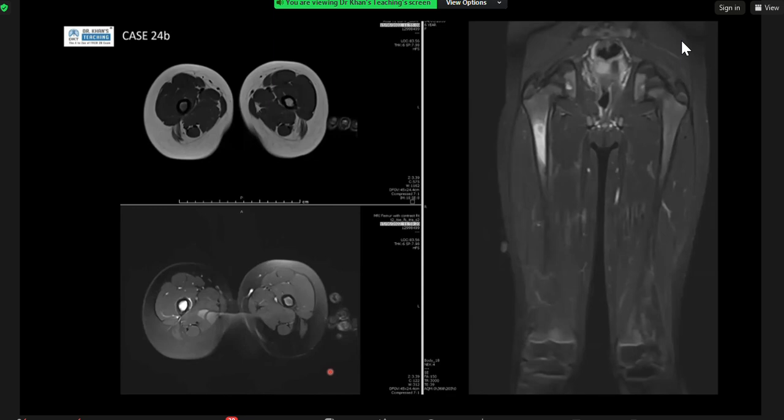No, I can't think. Okay, so are you quite confident? Are you going to tell them that's it? We're going to leave it alone, we're not going to do anything more, or are you going to say, I want to do more stuff? You can choose to repeat imaging. You can choose to do another scan, a different modality. What will you do next? I would like to do a CT scan of this.